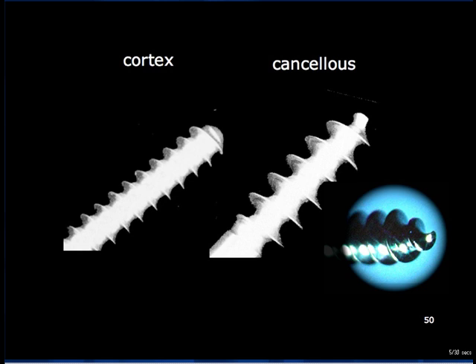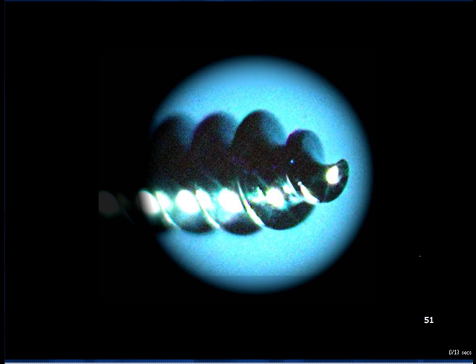In addition, the tip is of a different design for reasons to be explained. Note that the spiral of the helix increases from a point at the tip to the full thread diameter over 2 complete turns. Those cancellous screws that are not fully threaded have a smooth shaft. The head design is similar to that of the equivalent cortical screw. Cancellous screws create their own thread not by removing bone, but by impacting it aside, rather as a snow plough creates a path through the snow. The tip design achieves this.